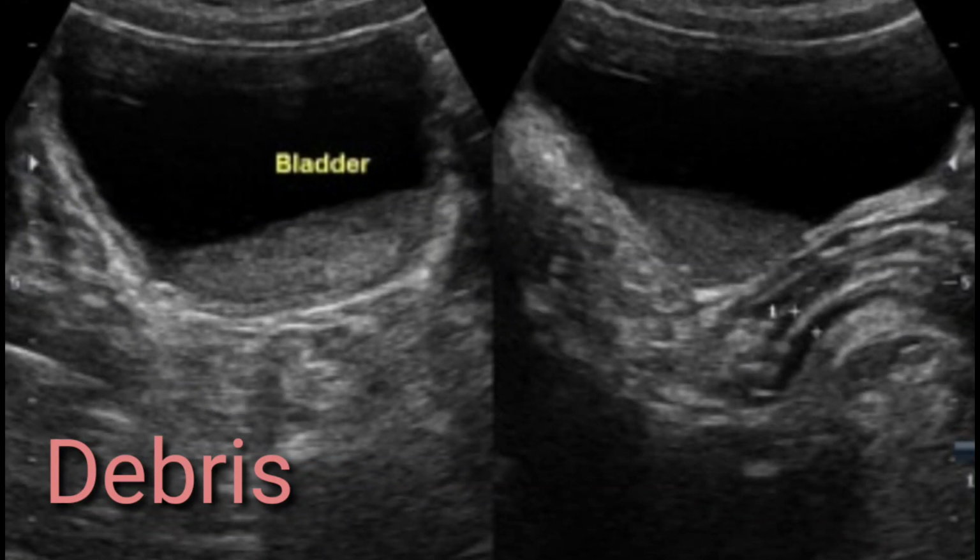Debris is slightly thicker content than the low level echoes, and usually it gravitates downward because of the gravity effect and sediments in the basal part or the dependent part. Look at this urinary bladder. In this urinary bladder, the upper part or supernatant part is anechoic, while a lower layer can easily be seen, that is debris. So debris is usually thicker than the internal low level echoes, so it becomes quite easy to understand the difference between the low level echoes and the debris.